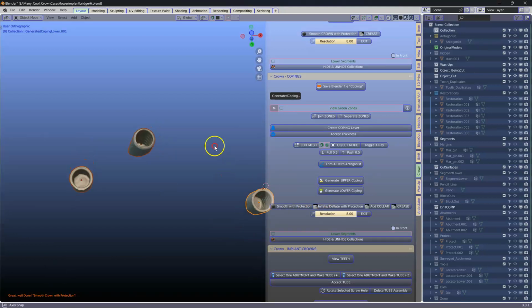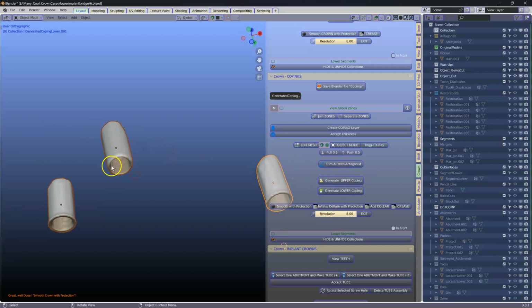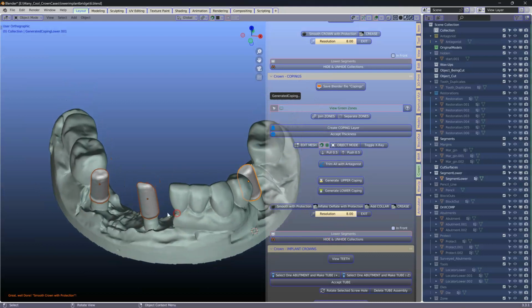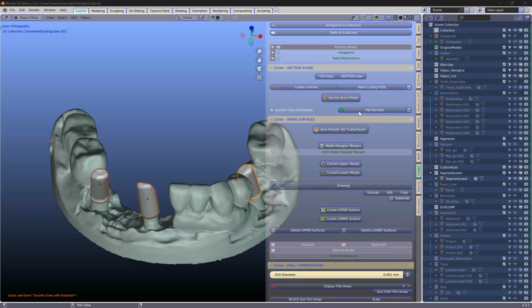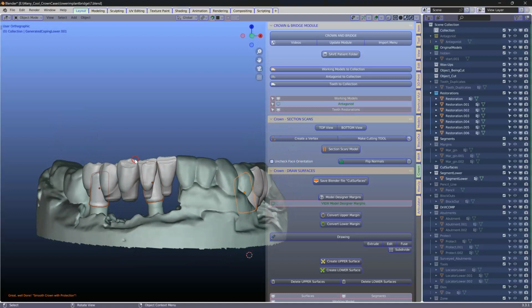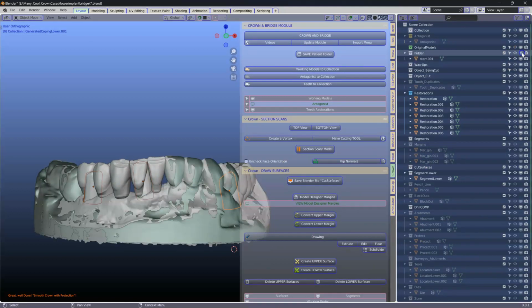Perfect. This is what they look like underneath. Okay, they've been blocked out, and we've got the safety, the spacer done as well. Alright, now we need to join our bridge to this. I'm going to run up the menu, look for my teeth, which are here. So we need to cut these teeth in. So I'm going to have a look at my hidden model, which is over here. I'm going to take this other one and just hide it for a minute.